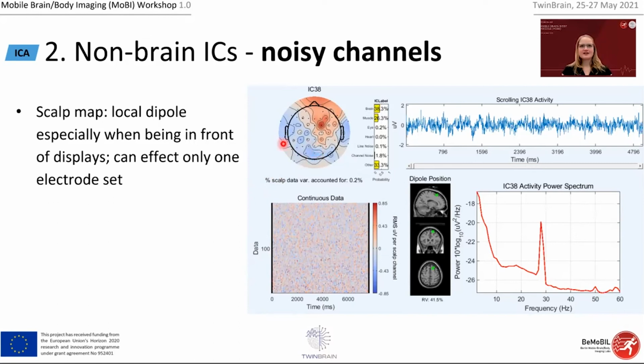Then you have two strands of 32 channels overlaying each other, and one of the strands captures more noise than the other, and you get this pattern that looks intertwined, with two strands capturing different electrodes. If you encounter something like this, this is at least my interpretation. You can have another opinion, I'm happy to discuss.